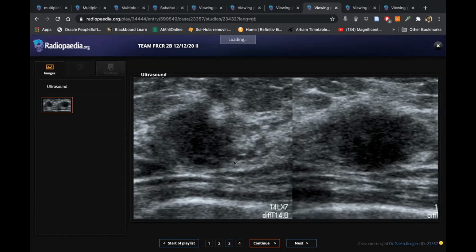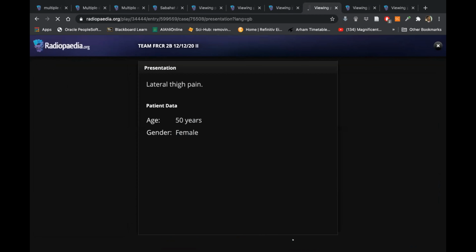You are doing good. You said all the right words. We also compare in the routine screening program. We will compare the mammogram with the previous. Excellent. That is all we need.